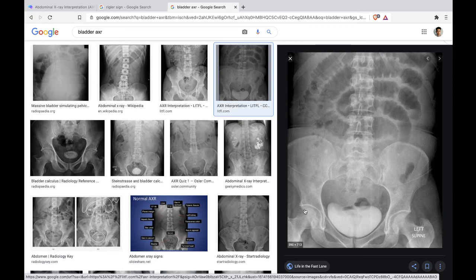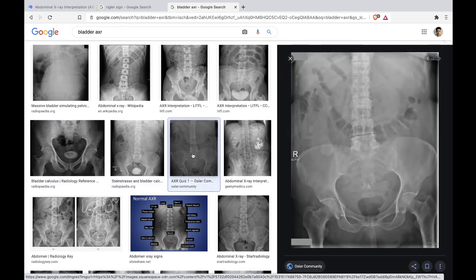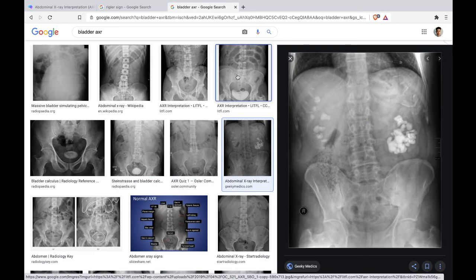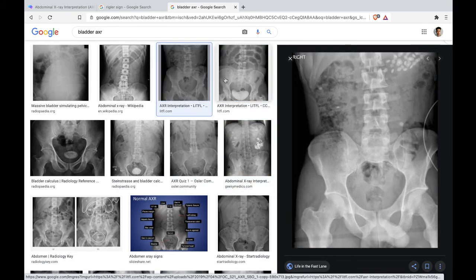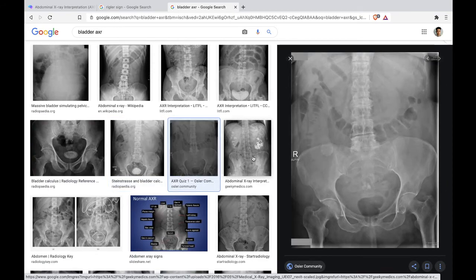It's very clear. It's filled with fluids. There's something in the bladder in this person. Okay. Should be somewhere in the pelvis. That's the rectum, not the bladder.